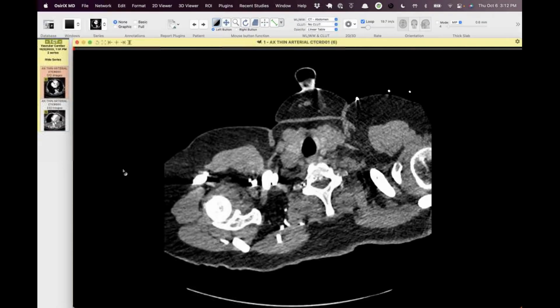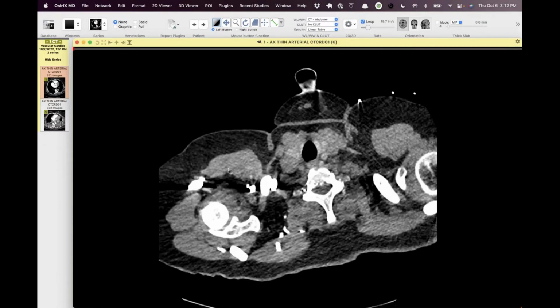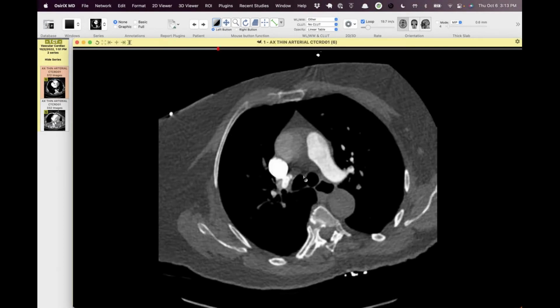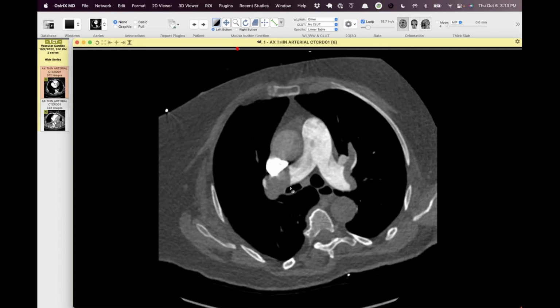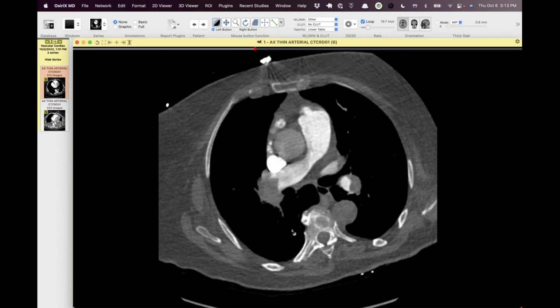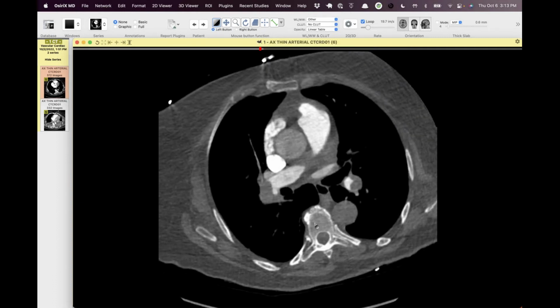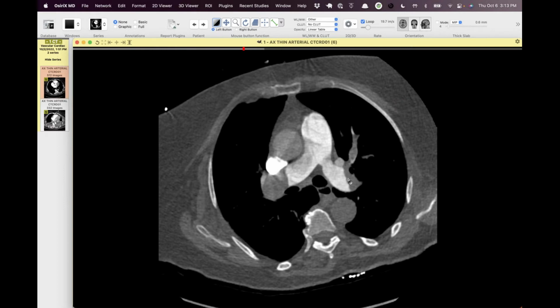And then this is, let's make sure this is the right one. Yeah, this is the first one, right? And then this is a patient where the pulmonary embolism is not the diagnostic dilemma. I don't remember this patient's history of why they came in with massive bilateral pulmonary emboli, but you can see that they do have them.